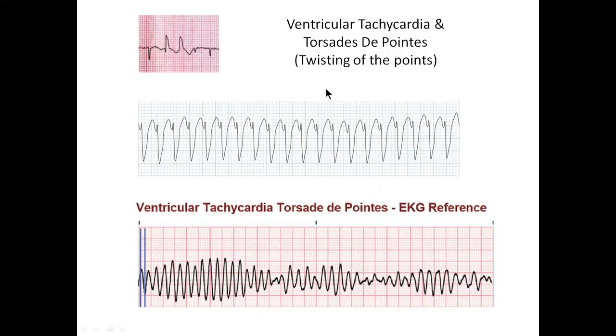All right. Next concept. Now, we know from the past that this is a tachycardia running at about a rate of 300 and the QRS complex is huge and it's regular. So, we know from the past that this is a ventricular tachycardia.